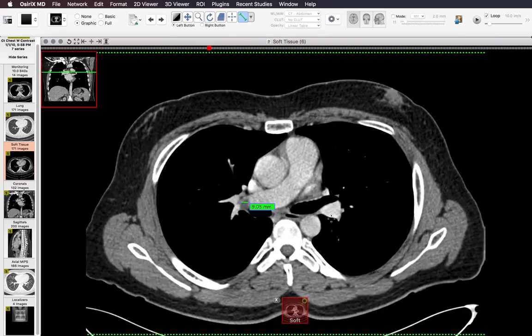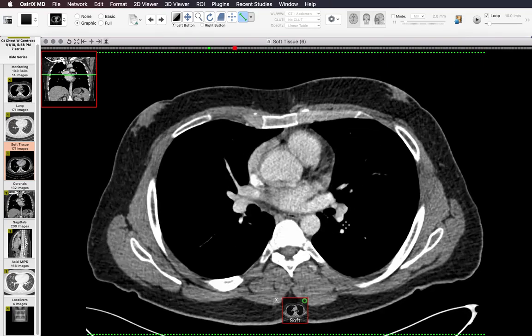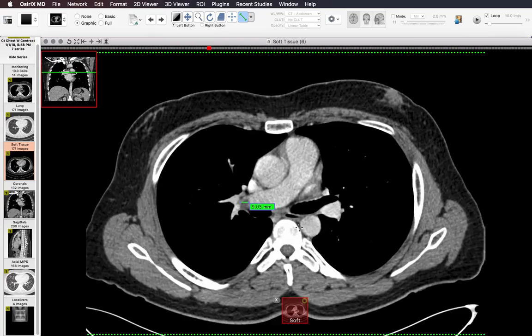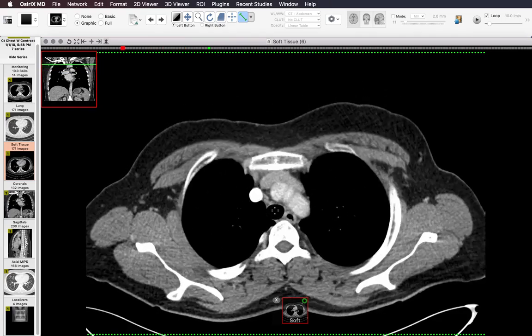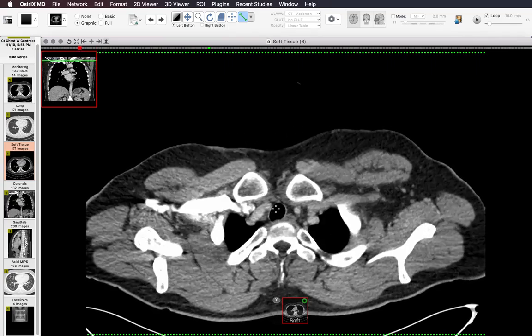Okay. The left hilar lymph nodes are not that size. Those are reliably pretty small. So if you see a 9 or 10 millimeter lymph node in the left hilum, that's something that you should point out, and that's abnormal. Then I continue up looking at the paratracheal region and the esophagus, looking for enlarged lymph nodes there, up until I get to the thoracic inlet.